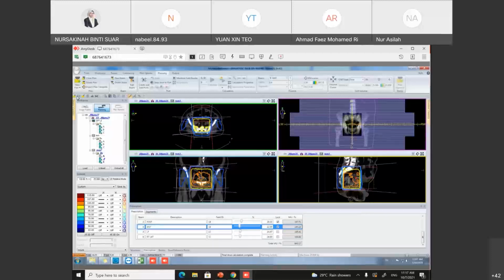You need to know how to answer: this is because the patient separation is big, and I aim to reduce the lateral dose. If they say there is no need to reduce the lateral dose, then you just put the beam back to 6 MV.